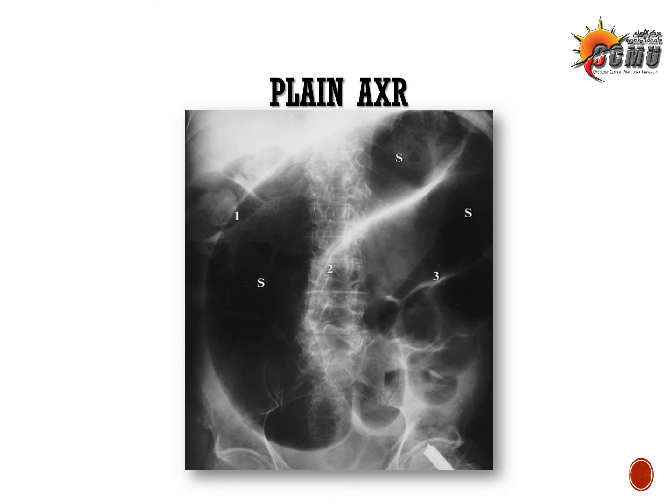Now this is a more clear view of a sigmoid volvulus. As we mentioned before, if the part of large bowel is maximally dilated or very much dilated, the haustra and septa are likely no longer present, like this large gas-filled loop without haustra or septi.